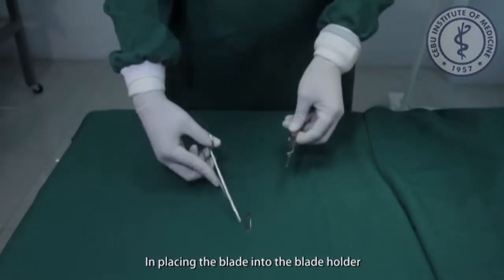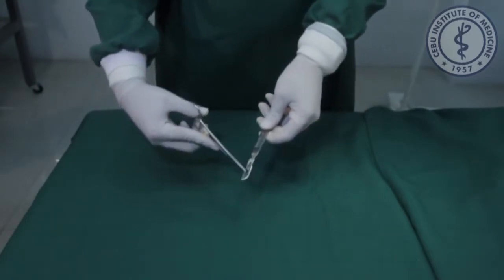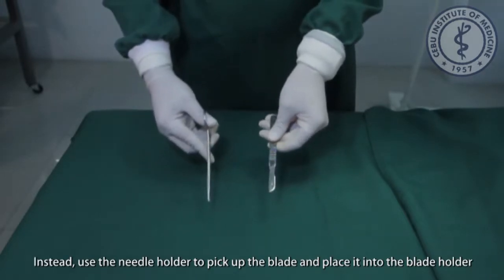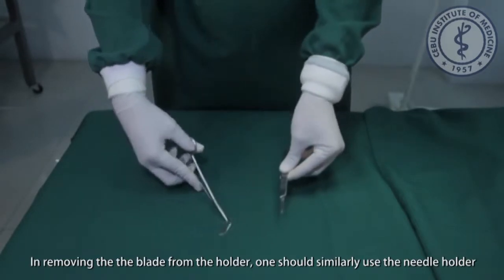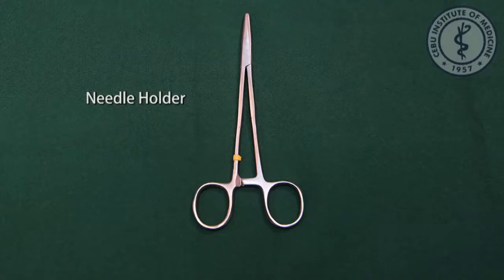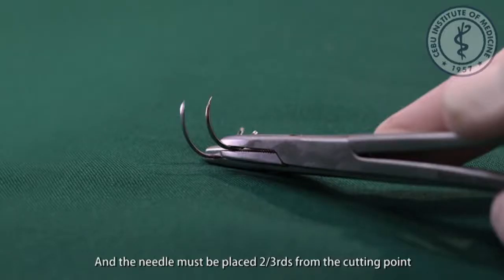In placing the blade into the blade holder, one should never use bare hands to avoid unwanted injury. Instead, use the needle holder to pick up the blade and place it into the blade holder. In removing the blade from the holder, one should similarly use the needle holder. The needle holder must be held in a tripod or palming technique, and the needle must be placed 2/3 from the cutting point.